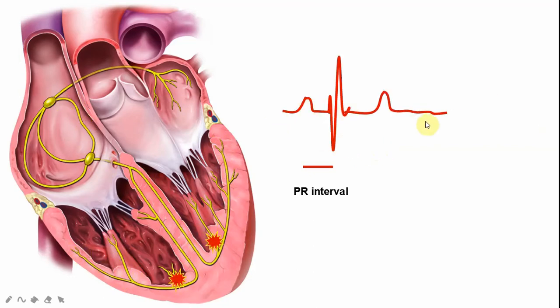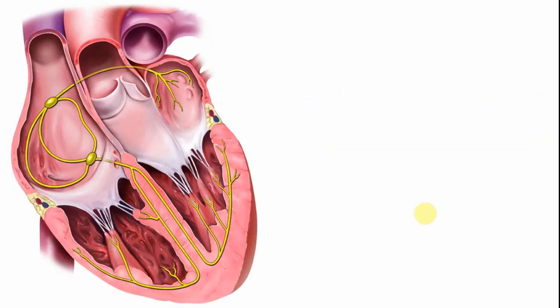Absolutely. So this is the normal ECG. So this is not interatrial pathway. This is called internodal pathway, these three. But if you can understand this normal ECG, then it will be very easy to understand the complete heart block. That is what is happening to our patient.